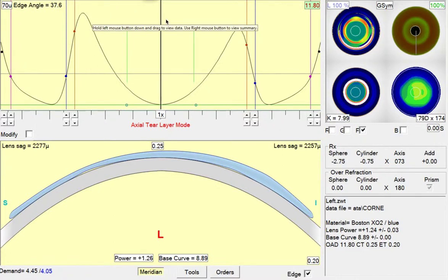In this orthokeratology case, we have a patient whose corneal toricity and refractive cylinder are at opposite axes. We can see that there is about 3/4 of a diopter with the rule on the cornea, and then 3/4 of a diopter against the rule in the refraction. So this suggests that this patient probably has around a diopter and a half of some sort of internal astigmatism. And as we mold this cornea, more and more of that internal astigmatism starts to come out.